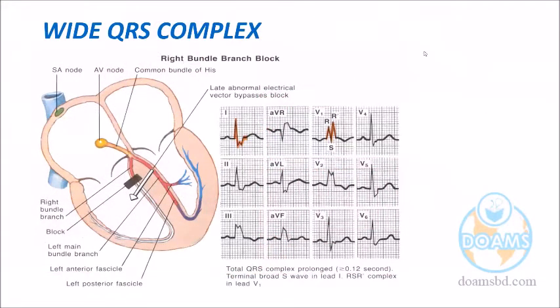Now come to the QRS complex. So our attention so far has been on the conduction problem in the PR interval, a very important area. Another is the width of the QRS and the appearance of the QRS. Many things are there. For that, I didn't make it as simplified as I told in other classes. So we have to attend to a little more things here.